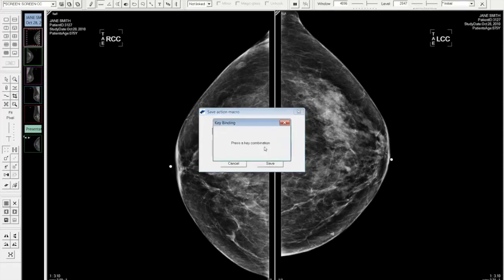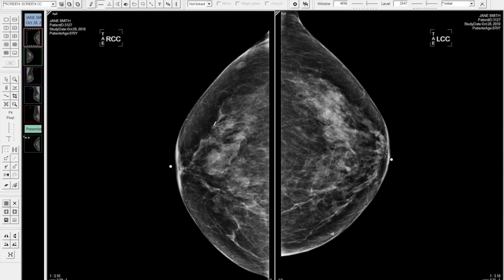And I'm going to choose the button that I want to represent my measuring tool, and I'm just going to do F2. Arbitrary. Virtually any key can impose just about any command. So I'm going to save that. So I can do a measurement. We've had training before on how to do multiple measurements. So I'm going to clear these.